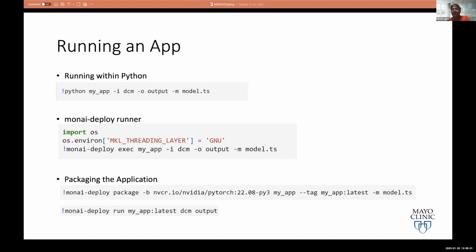Yeah, that's a great question, because though MONAI is PyTorch compatible, in this case you can use TorchScript. I think you can use TensorFlow as well. You can use direct PyTorch models as well, and I will show you. So it's not limited to TorchScript. I'm just showing it here because I had this example.